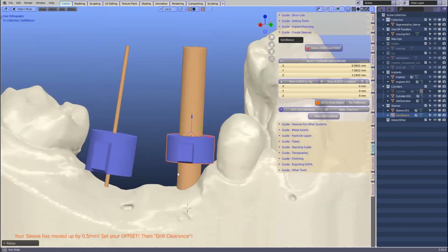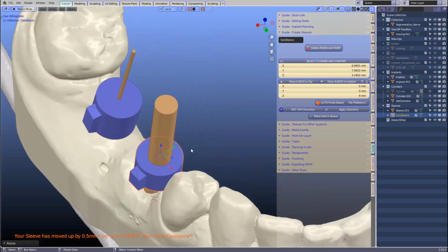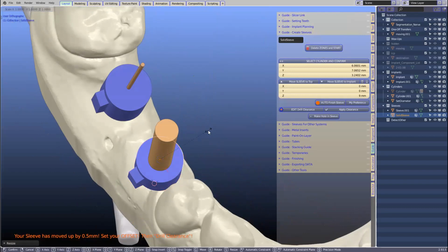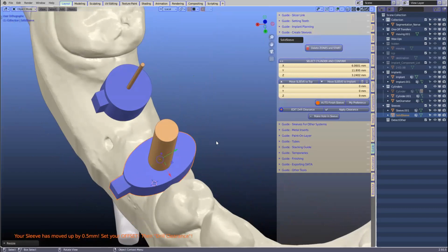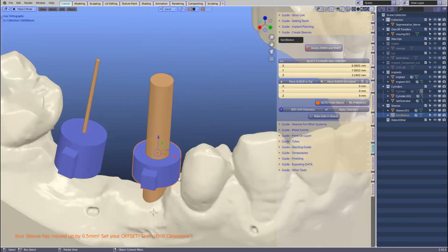Another thing to note is that if you've got a lateral incisor or something, it doesn't have to be round. You can go SY and make it like this, to fit into the gap of the teeth, so there's no reason why it should be round.